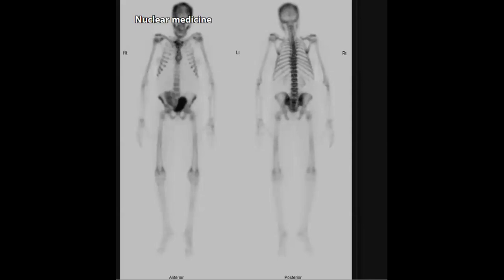This kidney uptake, there is soft tissue uptake. Yes or no? Maybe super scan. But in such a case, take care about something. What do you think about the bladder? The urinary bladder in this case is displaced by something here. What could this be?